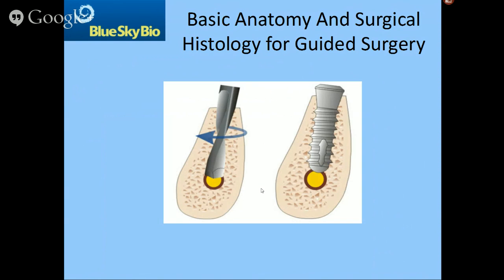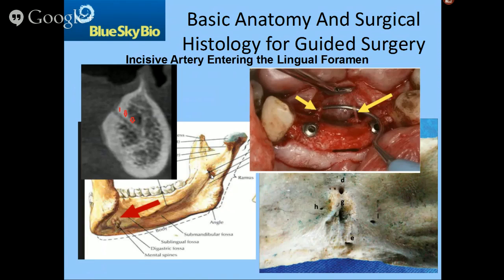And sometimes even if you don't place the implant too close to the nerve, you just basically touch it. But unfortunately, the osteotomy is often longer than the actual implant itself. So even if you look like you might have been safe on your final, or maybe just barely touching it, somebody may have actually hit a home run on the nerve when they were doing the surgery. So it's really important to isolate this, know where this is going to be, and keep yourself enough distance away to prevent yourself from running into a problem.